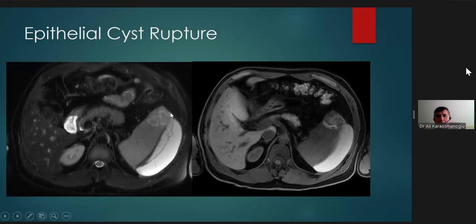So here is the MRI. On T2 weighted image, you can see a slightly hyperintense area in the anterior aspect of the spleen, and there's a large subcapsular fluid, likely consistent with a hematoma. You can see it's crescent shaped, T2 hyperintense, fluid intensity.